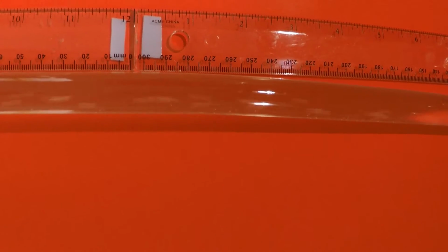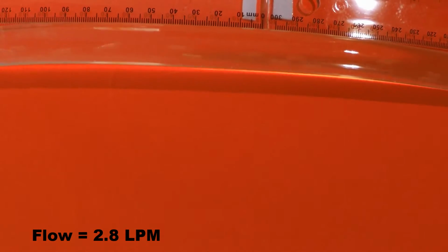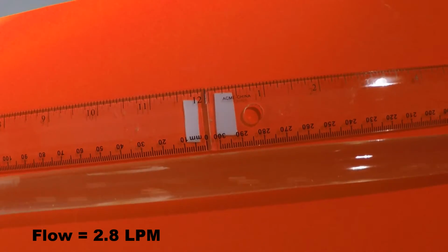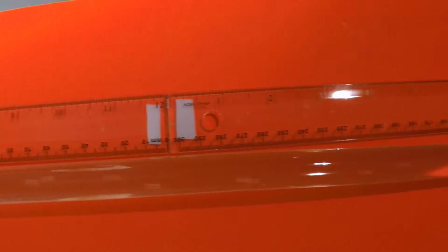In this clip, air injections are again repeated while the flow rate is increased further. Now the bubble tracings are less erratic and follow a more uniform path as the turbulent flare from the connector is stretched out, giving way to a straighter, more laminar flow pattern.